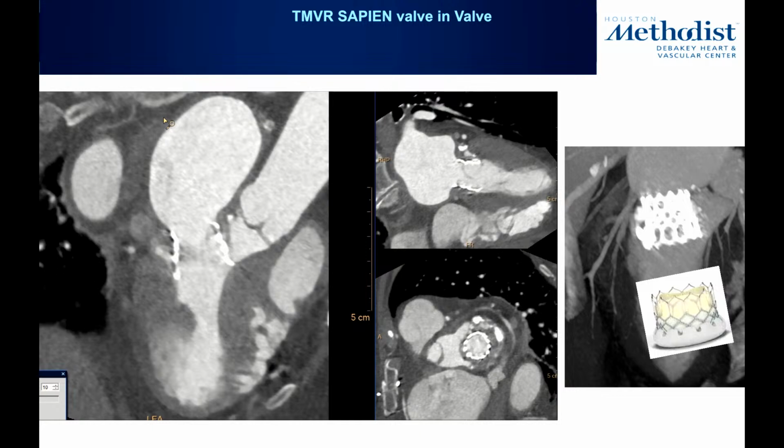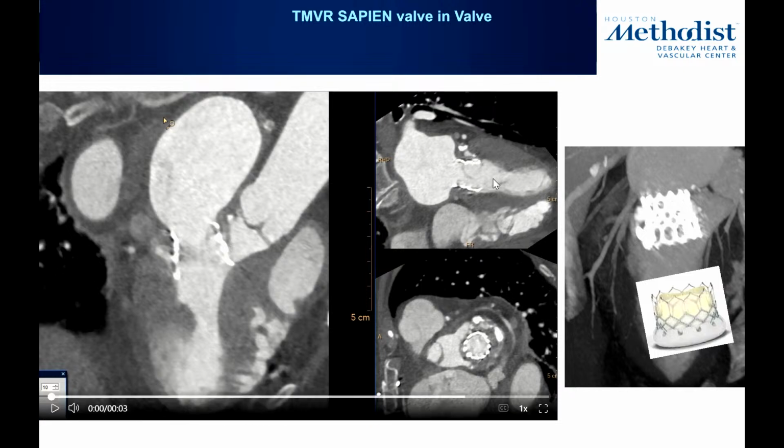Obviously, there's some resistance to flow from the wire, but usually it's not significant, unless that valve has pushed the anterior mitral leaflet into the LVOT, and that's a flat surface. Then you might have a resistance to flow, right? So that's very important to realize that visually you might see something. Some part does have a strut, obviously, but usually, as Carlo said, not the whole thing is covered.